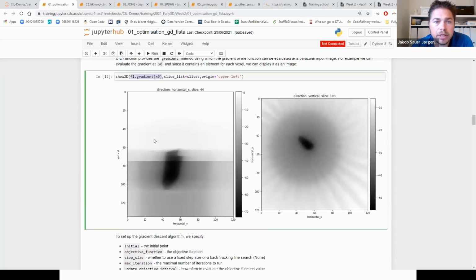So apparently, our gradient looks like this. And I guess that means all of this is 0. So if you take a gradient step, not much will happen up here, whereas there's a big change here. You'll see a larger difference happening in this area. And I guess that's to be expected because this is already 0.